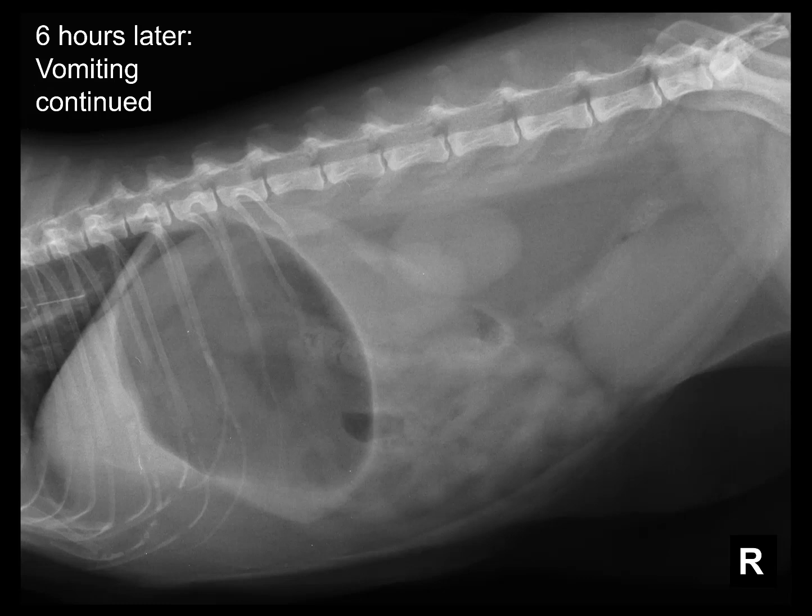The stomach is huge, mostly gas-filled, although there is some fluid here ventrally on this view. The small intestine remains relatively unexciting, but there has been a pretty substantial change in the stomach, and as I mentioned before, there is that disconnect between stomach and small intestine. If the stomach's so big, why is nothing getting into the small intestine? Is it that the stomach is just functionally stopping, or is there actually a mechanical issue, some sort of relatively proximal obstruction, whether that's pyloric or proximal duodenal?